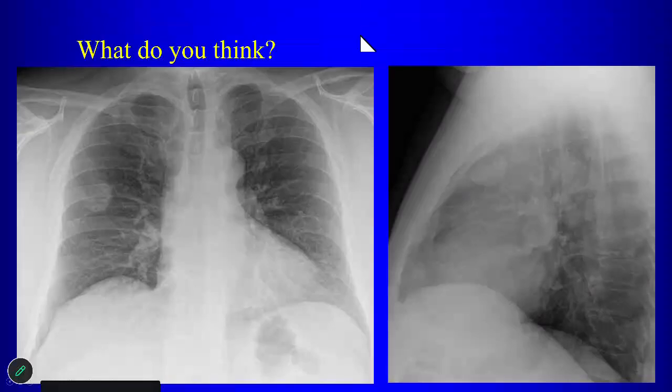Right. Who wants to tackle this chest radiograph? On the image on the left, there's a right mid-lung opacity with loss of that lateral border. And we call that the silhouette sign? Yeah, how's your short-term memory? When the border disappears, we call it the disappearing border sign. There you go. So there's a disappearing border sign.